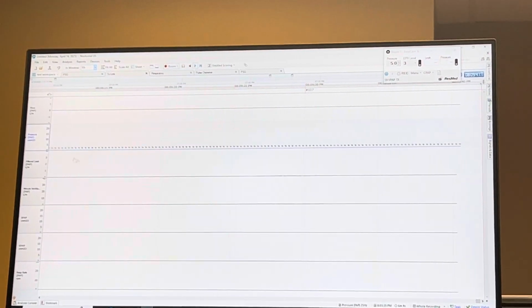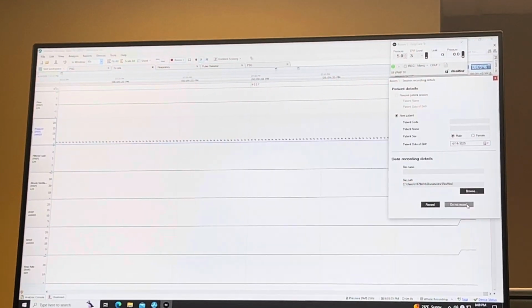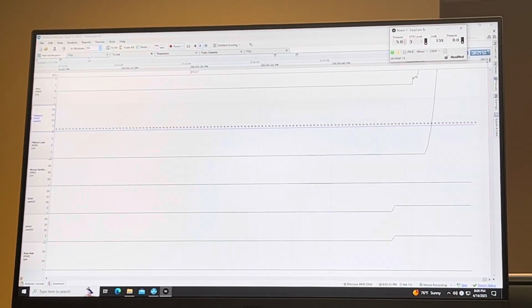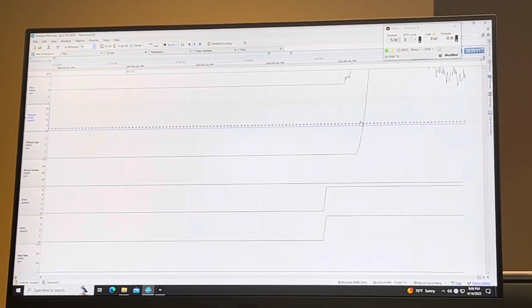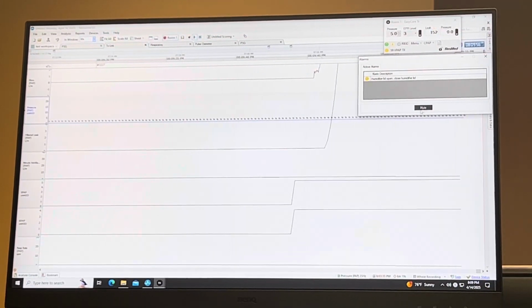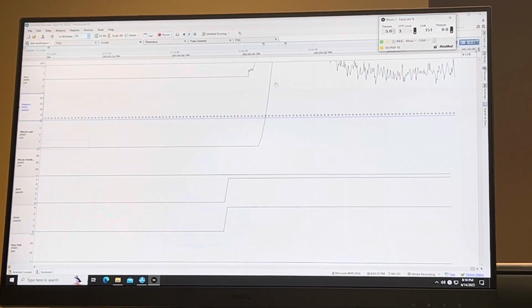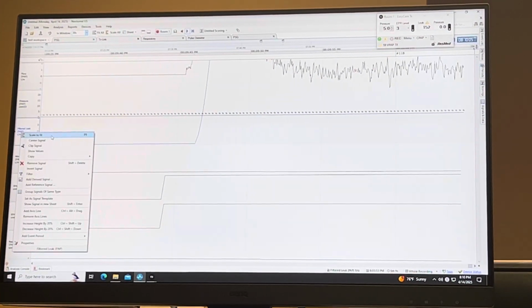So if I turn this connection on, it doesn't come up on the PSG screen? I will add it when we fully make it.